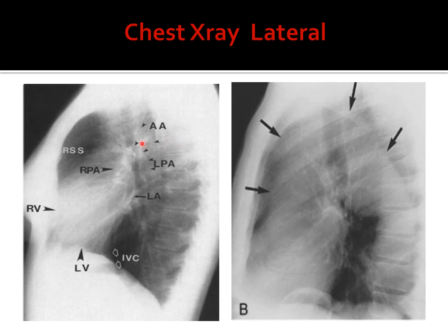So this is a normal radiograph. On the lateral projection, you can see the retrosternal space, the right pulmonary artery, the right ventricle, the left ventricle, the IVC going up, the left atrium, the pulmonary artery, and the aortic arch. Compared to the lateral view of that patient, you can see here a density secondary to a markedly dilated aorta, ascending aorta, and aortic arch, and up to the proximal portion of the descending aorta. So this is your aortic aneurysm.